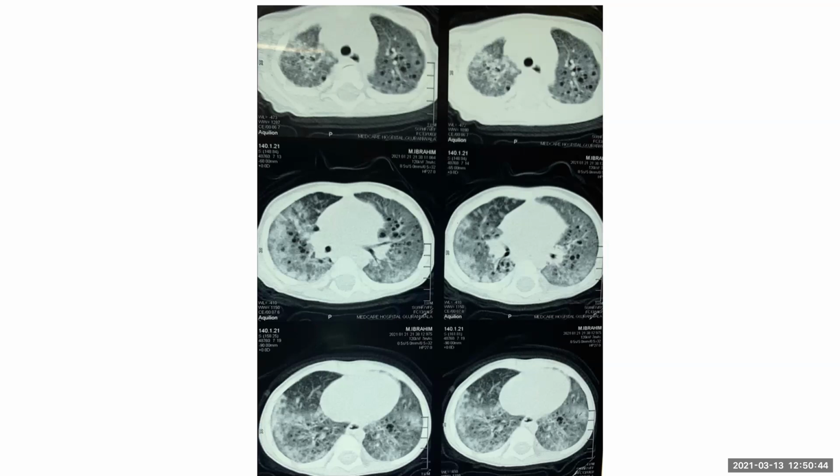The striking abnormalities are multiple bilateral small lucencies present in the bilateral lung fields. Apart from this, I can also appreciate a significant bilateral patchy ground glass haze, as well as peripheral consolidation, especially in the right lung.